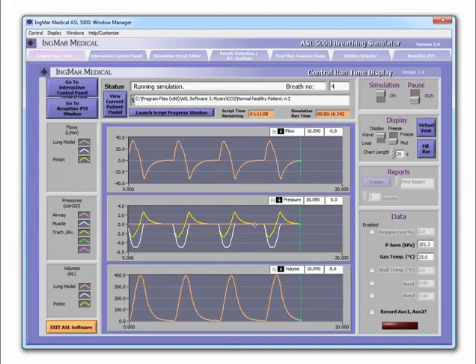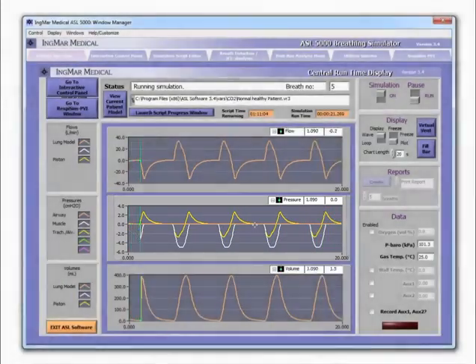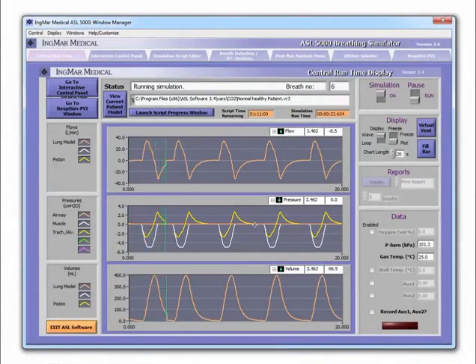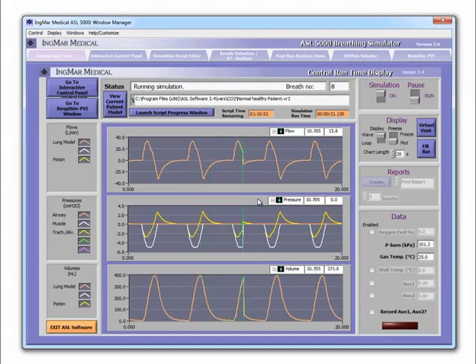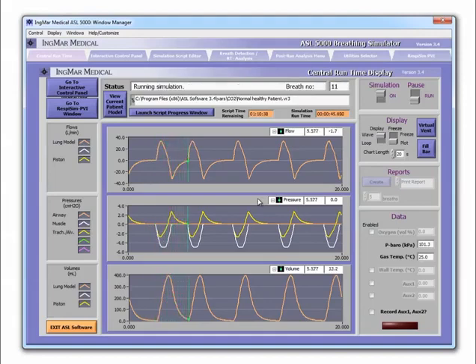And what we see here is a muscle pressure, inspiratory effort, and resultant flows and volumes. So whatever lung model this is, we have a resultant 400 milliliters of tidal volume with an effort of about -5 centimeters of water. Now if I'm a simulation facilitator, my goal is to activate whichever lung model should be activated during my simulation at the right time. The best way to do that is through our interactive control panel.